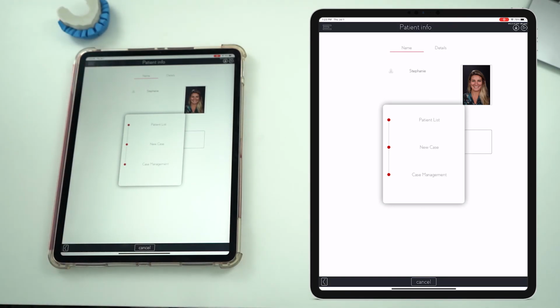So now it's your turn. Practice more. Add your patient's files into SmileFy software and create your own dental mock-up to deliver a facially guided treatment plan to your patients.